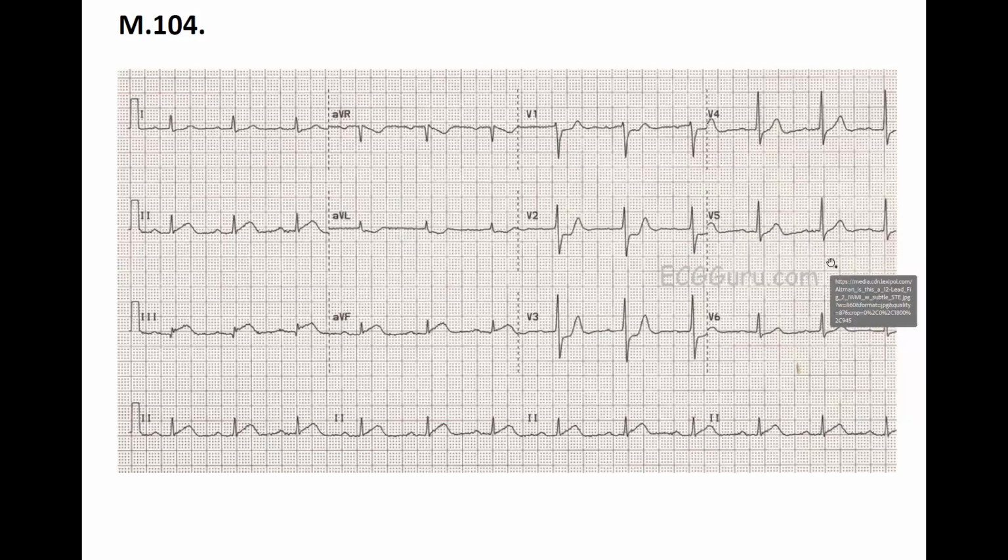So I'll start with rhythmicity. It appears to be rhythmic, based on the rhythm strip we can see. And I think the heart rate is around 75, 80. 1, 2, 3, 4. It's about 4. 75 is fine. It's okay, good. Sorry, I'm writing my notes in the meantime.